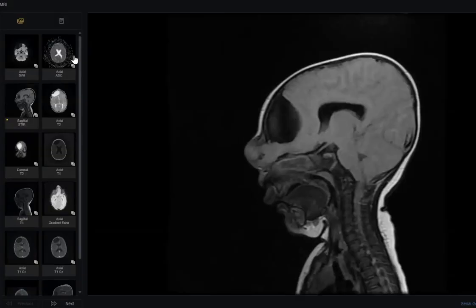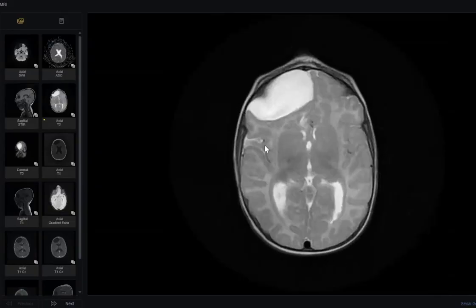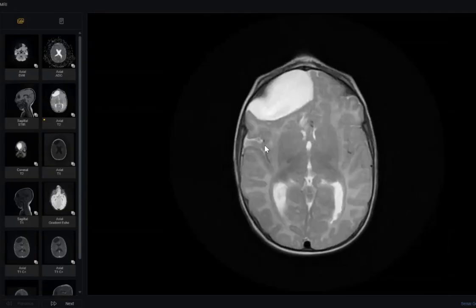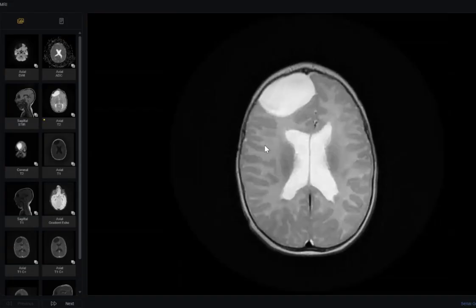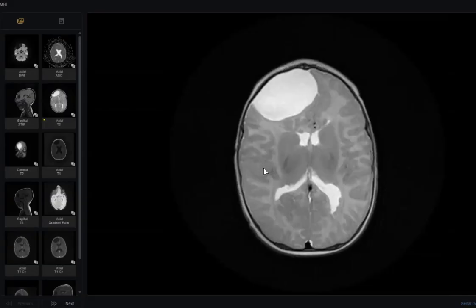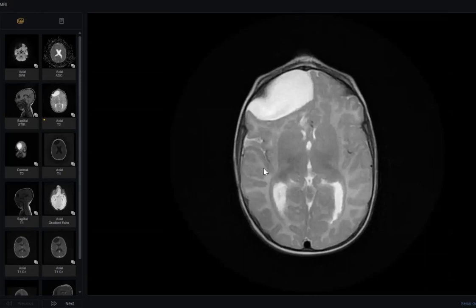The first thing will obscure your search: this large arachnoid right frontal cyst. You may miss some of the findings, but our doctor really was brilliant. See here, there are subependymal nodules, almost heterotopia. Somebody may tell us, doctor, it may be tuberous sclerosis.